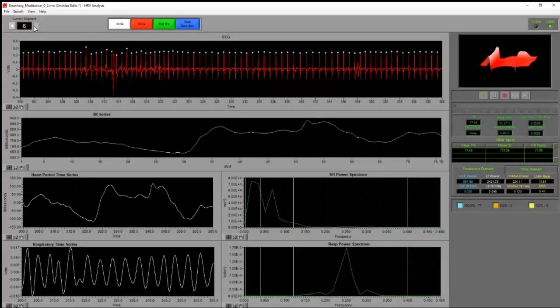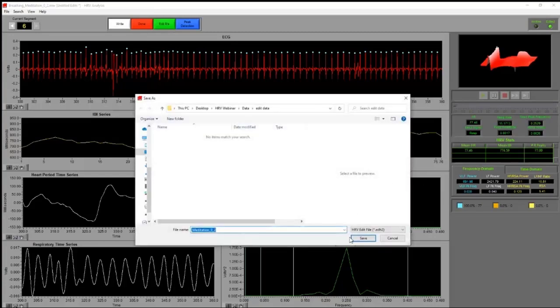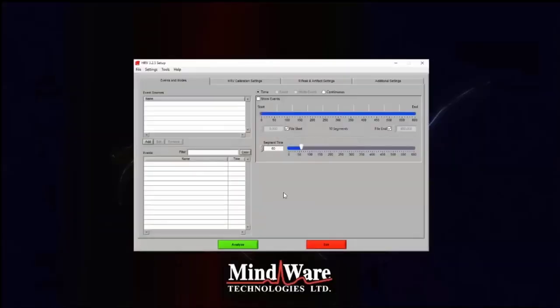All right, so there is our middle condition of cleaning that information. I'm going to go ahead and continue to save my data here, as you normally would. And then we'll look at that last section really quickly here.